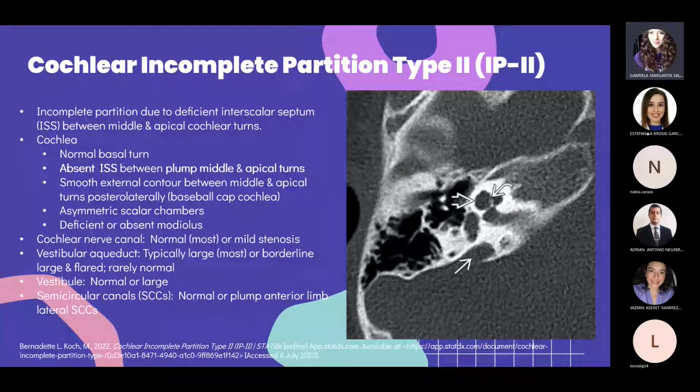That's also a name where you can find the cochlear incomplete partition. They are like synonyms: Mondini triad or cochlear incomplete partition type 2. And this wasn't the case of our patient either.